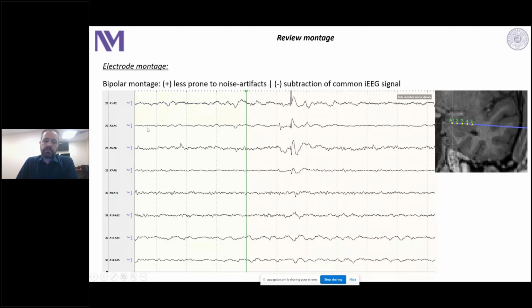You can also observe that the EEG background here is suppressed, which is weird because the deepest one has a more mixed frequencies profile, and same as the lateral. If we were in the extracranial EEG, we would say, okay, there is notable suppression here, and there seems to be phase reversal. So perhaps the heart of the irritation here is between A3 and A4.